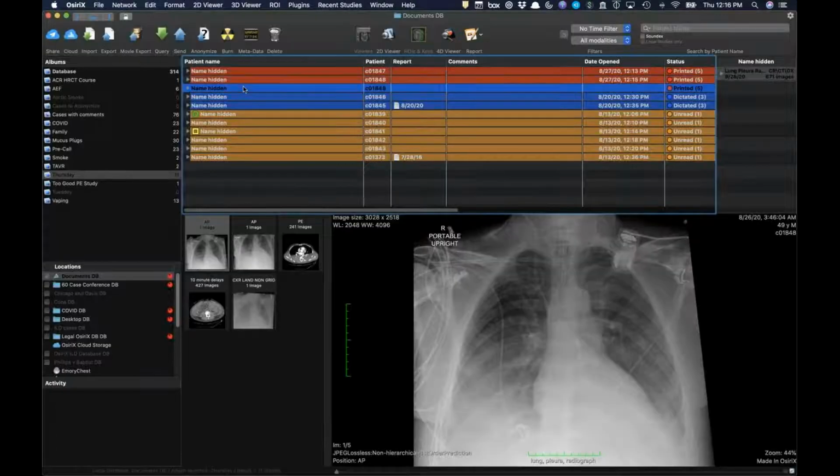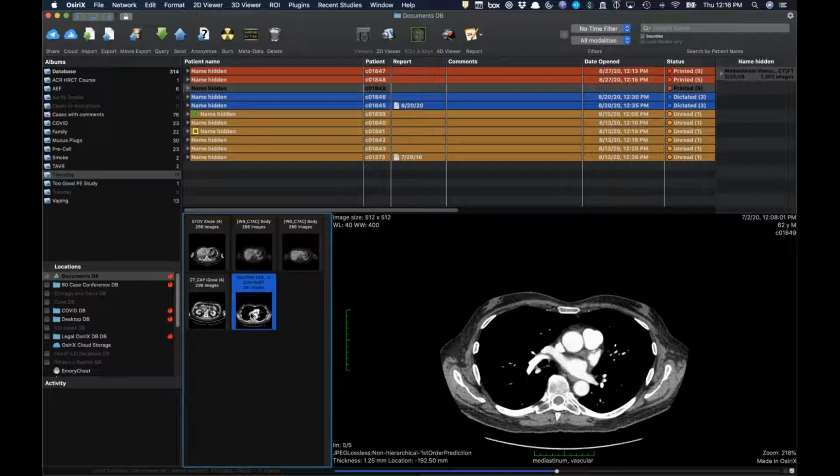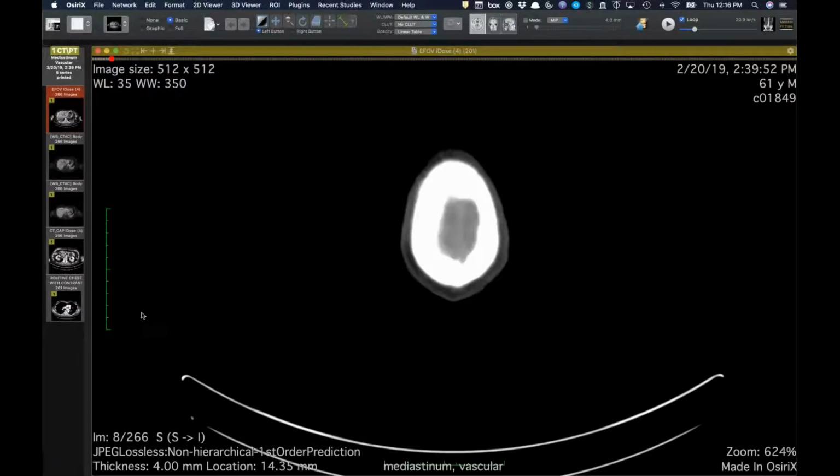Yep. Very nice. No, a great demonstration of that. We see that a lot, obviously, particularly with bedside radiography in ICU patients, trying to distinguish between pleural fluid, atelectasis, or combinations thereof. And I often dictate opacity in the basal hemithorax, which likely represents some combination of pleural fluid and adjacent lung atelectasis, not knowing how much of each is present. Right. Yeah, that's what I'll often say. It's like atelectasis and/or effusion.